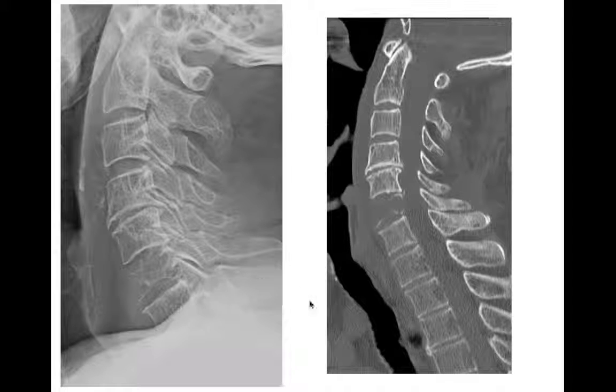We'll get a better shot of it on the CT. It shows this lytic lesion. Most of the vertebral body is just taken up by this lytic process. So we see an older patient, we see this lytic lesion, this thinned or maybe destroyed part of the cortex or the end plate of the vertebral body here. We're going to worry about this, and we're going to think Mets or multiple myeloma because of their age and because of just how common they are.